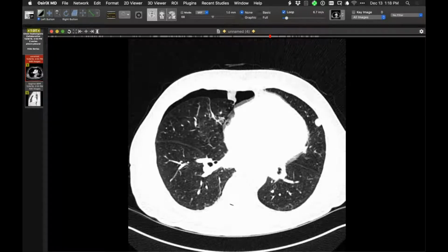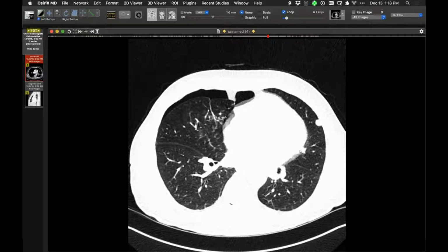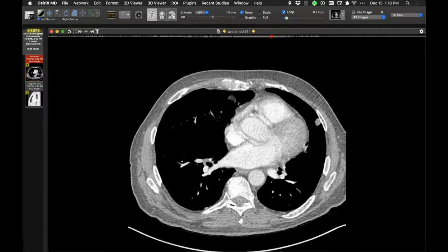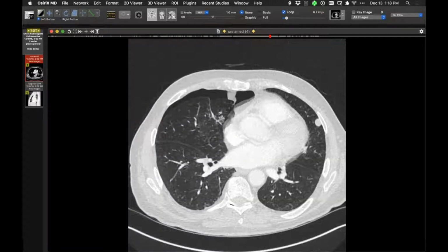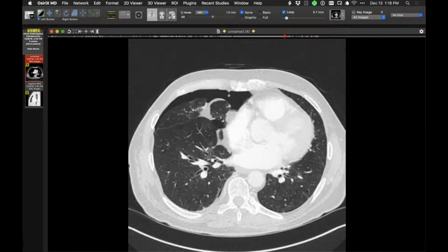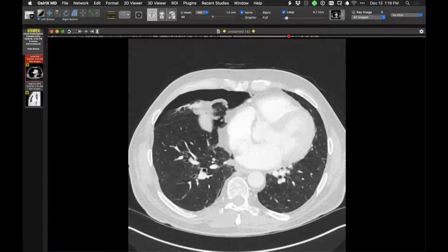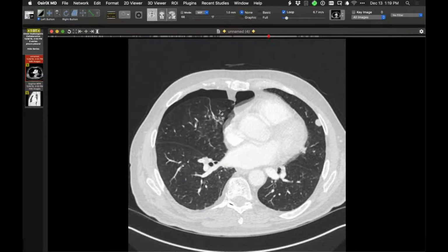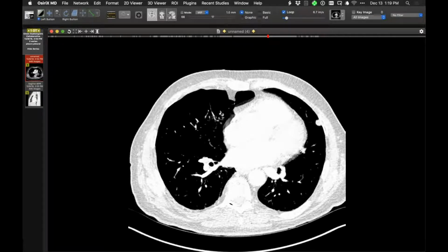It's almost like there's a little bit of chest wall fat that is, in a sense, sucked over or dragged from its location and touches the visceral pleura. I don't know what that anatomy is, but I think I've seen it before and I don't know what to call that. I think I've sometimes seen strands of tissue that traverse the pleural space in a pneumothorax, and this is the first time that I've been able to perceive that the bigger one is fat. So isn't that just interesting and curious? I'm not quite sure what I'm seeing or why.